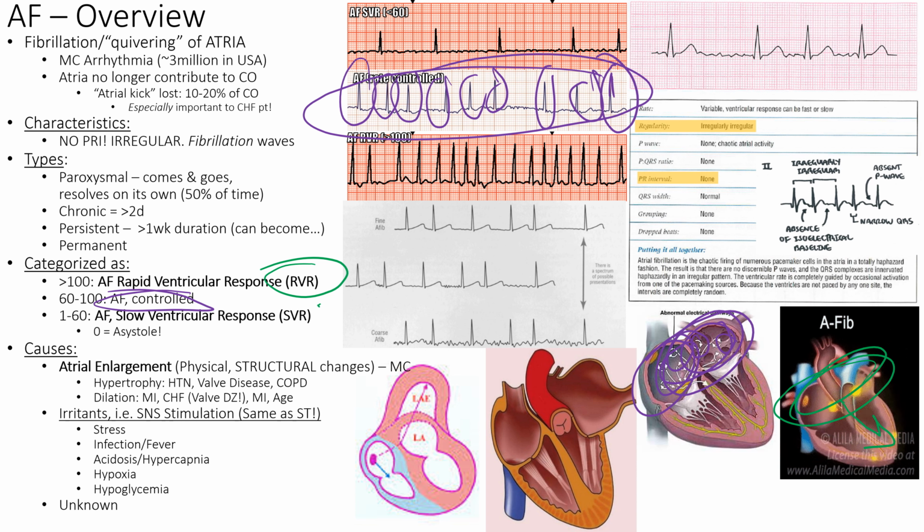And what the heck's a fib wave? It's just something you can't really discern as a P wave. It's just fibrillatory activity. It's shaking. Fibrillation just means shaking.